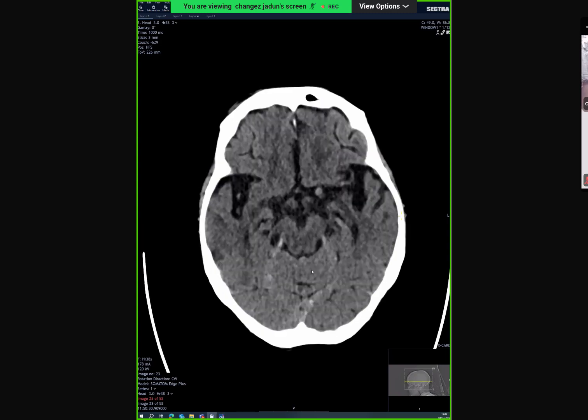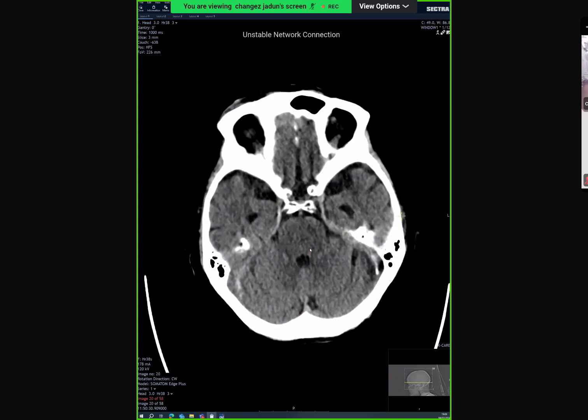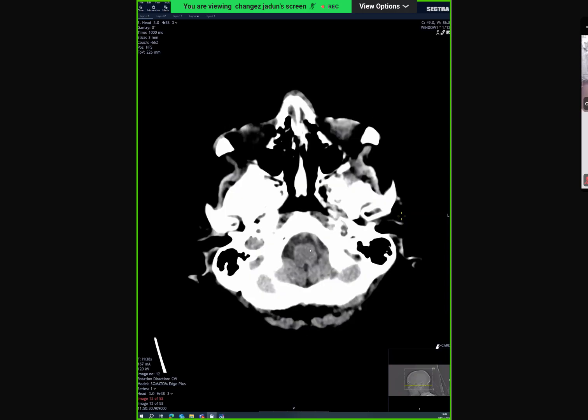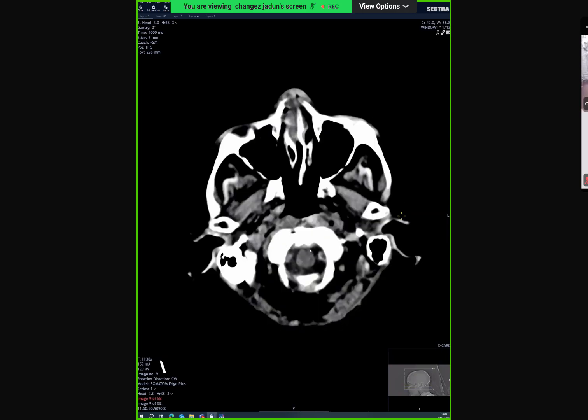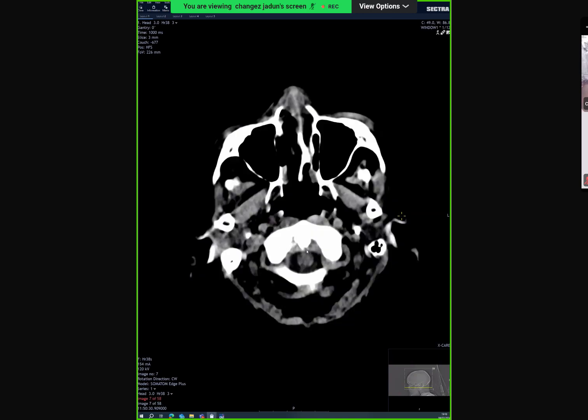So this tells the examiner that you have seen the high density, but you have ruled it out, that this is not real. It is because of the calcification. Now, the very important thing which I expected you to do, which you did not ask, so I did not give you, was you did not ask me to show you the bone window.